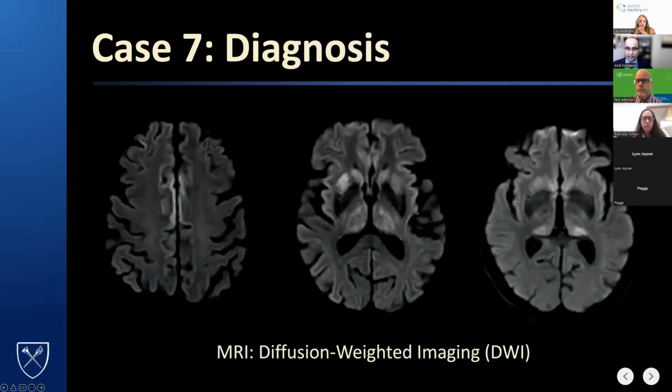All right, last case is based on these diffusion-weighted MRI images. So diagnosis, please.